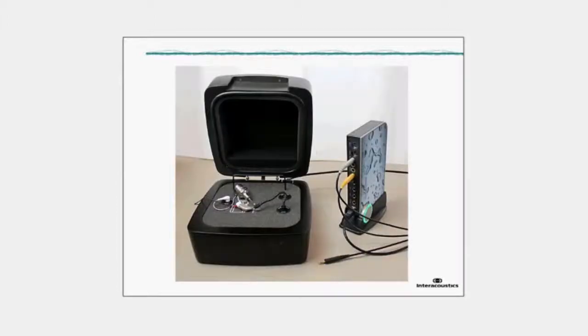Here you can see a connected example of the TBS-10 alongside a Callisto. Even though we've added the TBS-10, we have not removed the coupler base from the item list, meaning that you can still buy this for a more portable solution when working away from the hospital or clinical environment that you're used to working from.